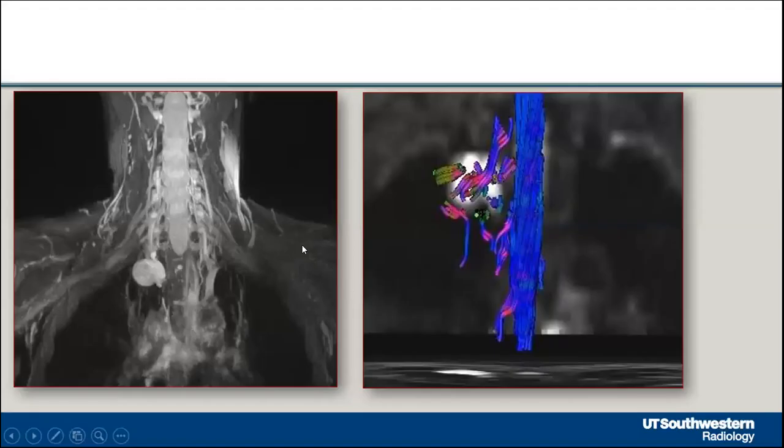It's a benign tumor. Versus this kind of tumor, there's more anterior near the spine where the ganglions are, and most of the nerves are passing around it. The ADC is high, 1.9, so we know it's a benign tumor. That's how paragangliomas look like.